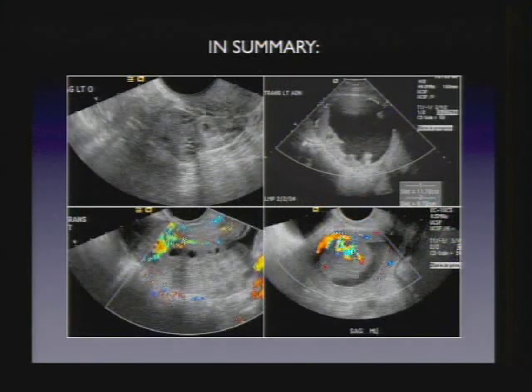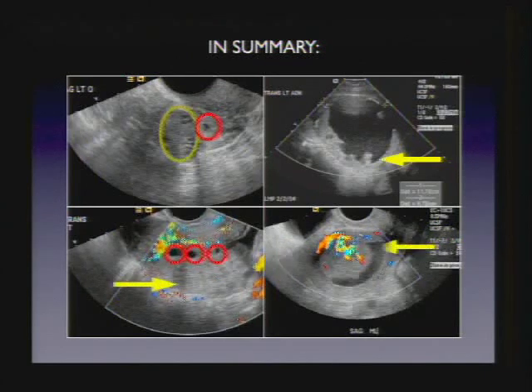And in summary, we reviewed the approach to ectopic pregnancy, also how to separate corpus luteum from an ectopic pregnancy, how to recognize malignant lesions in the adnexa, and the very classic appearance of ovarian torsion with edematous stroma, enlarged ovary, follicles pushed to the periphery, and recognizing the endometrial cancer when you see it.